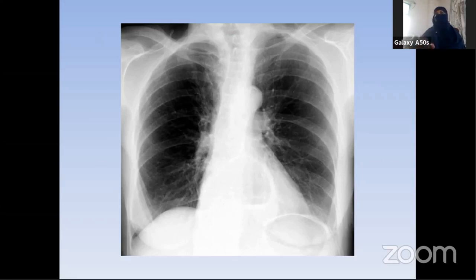And there is cardiomegaly, you see. There is cardiomegaly, and the lung fields are clear. But here, one thing you can notice through the cardiac shadow is a long air fluid level. This large and long air fluid level seen through the cardiac shadow is basically a hiatal hernia. So this is a case of hiatal hernia.